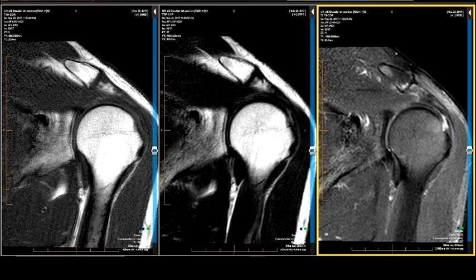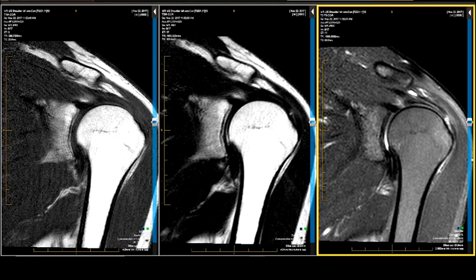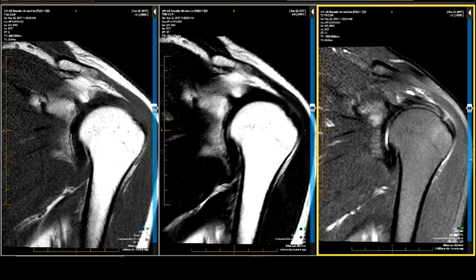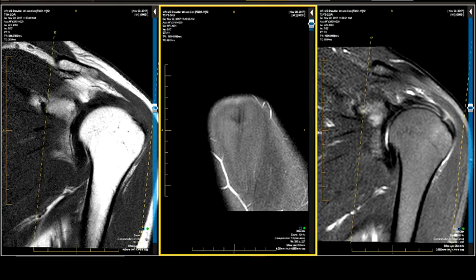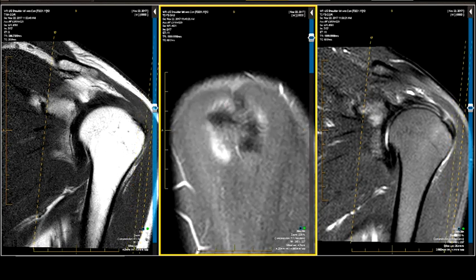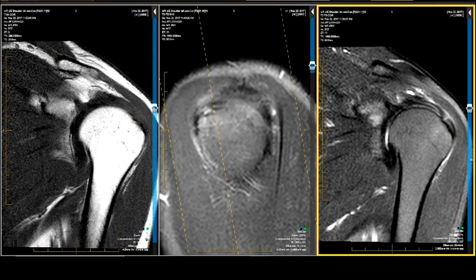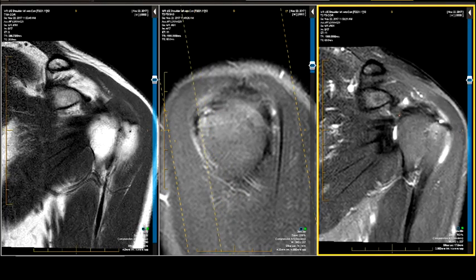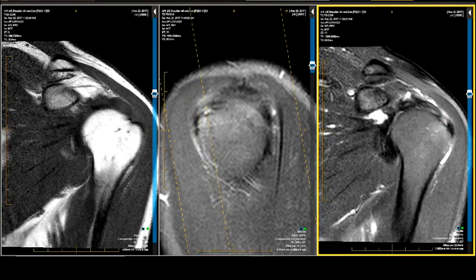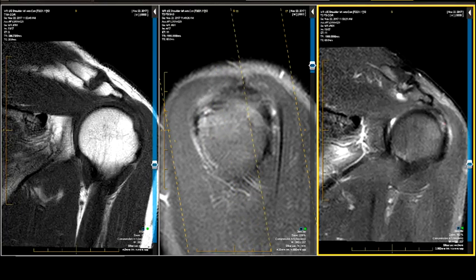So what should we call this thing? It's in the back. It's got a weird shape. It's got a little bone penetration. It's linear again. It's coming forward. Then all of a sudden it turns vertical. And where does it do that? Let's see where we are. I mean, what are you going to say about something like this where you have dots and spots everywhere? See where this thing is. It's in the supraspinatus. So we have supraspinatus involvement. It's pretty penetrating. We have infraspinatus involvement. It's one tear.